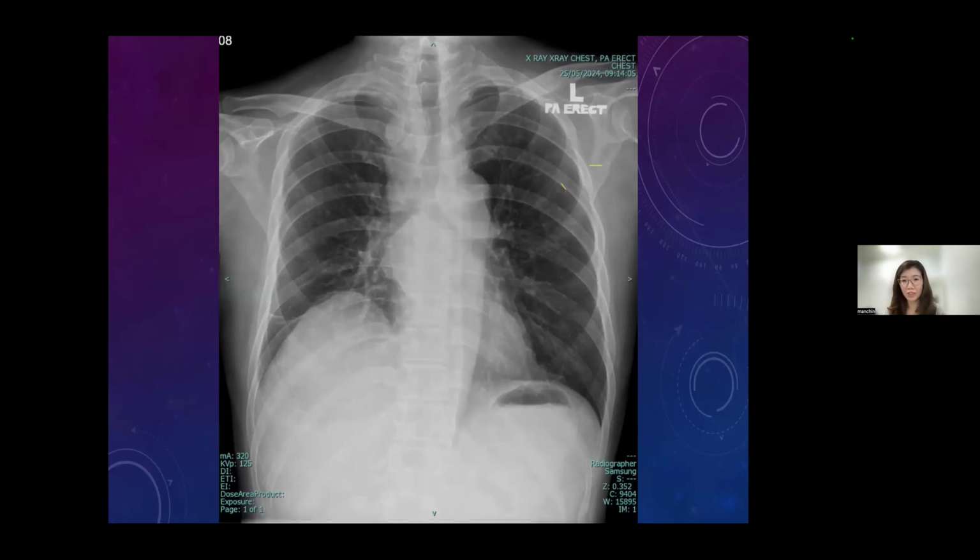This one we must finish by today. Again, this is about the review areas. This is the splaying of the carina. Lung fields quite clear, and some fibrosis at the right lower zone, doesn't matter. Costophrenic angles clear, so review the apex, then mediastinum, and then trachea. There's a splaying, it is widened. This one we showed during the last session as well.